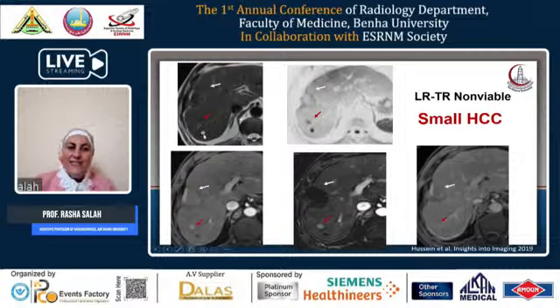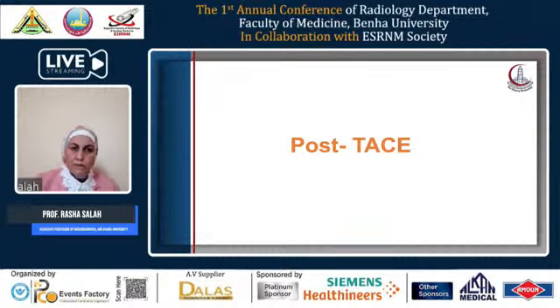We can also assess another different pathology located within the liver, this smaller lesion, which is hyperintense on the T2 weighted image, and it shows no appreciable enhancement, and it is just a simple hepatic cyst. So MRI can categorize multiple lesions, with characterization of every single lesion separately, with more accuracy than CT.